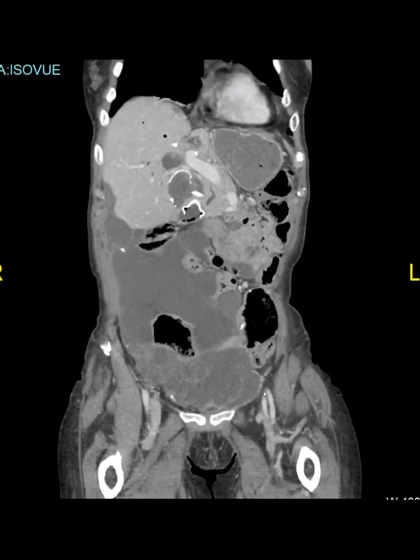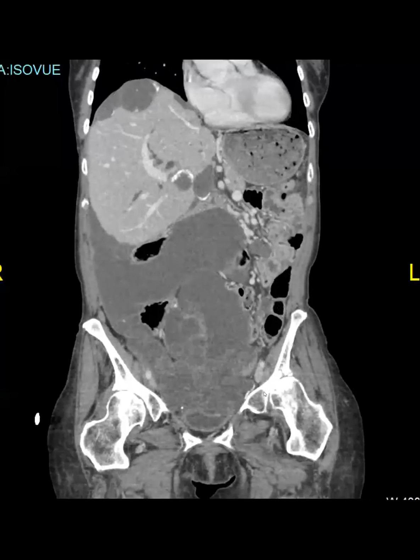So actually that's interesting, because I wouldn't call this pseudomyxoma or DPAM. This is actually mucinous adenocarcinoma, which is a very different thing than our normal pseudomyxoma, which is more acellular mucin. This is an insane case. Right. Yeah. All right.